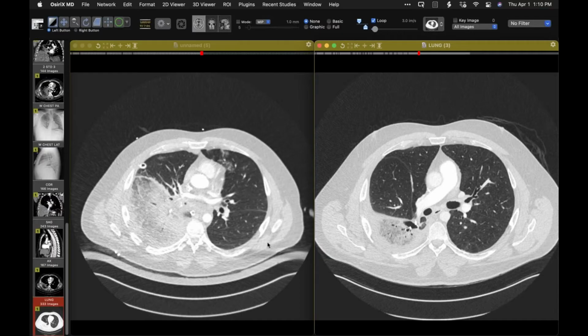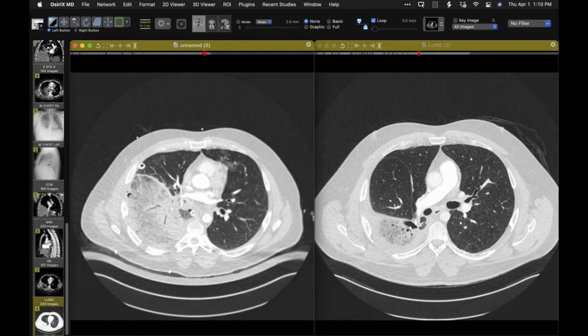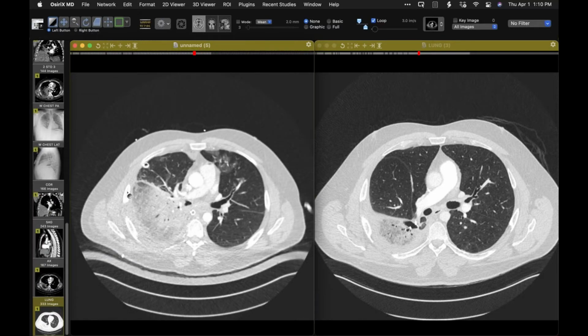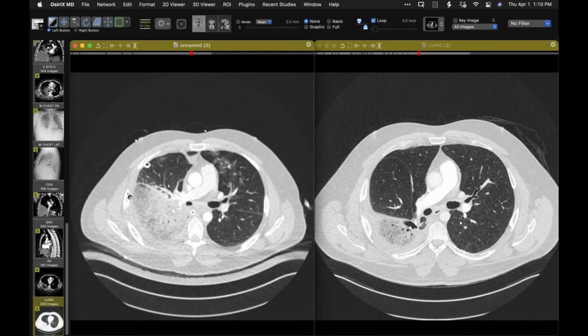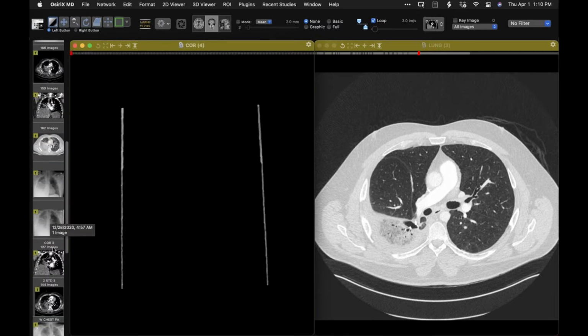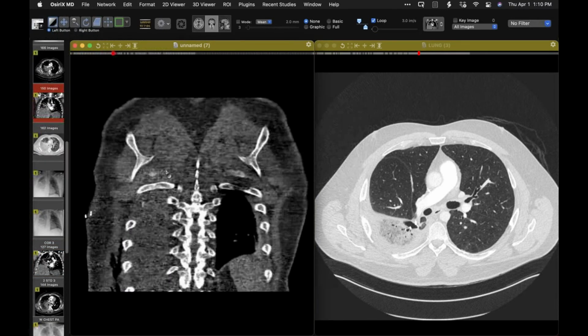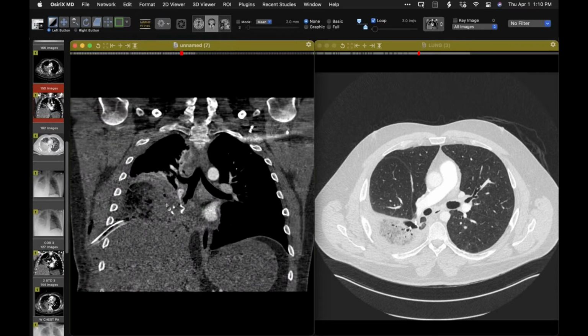Any comments otherwise? Do you think I have it correct? I agree. Yeah. That's venous. You said venous infarct, right? Well, I think, in relation to that pulmonary artery, let me go back to the coronal. I think it's likely, let me go back to say this. I wasn't looking at the imaging. I just kind of had that venous infarctable lobe appearance, but did they knock out the PA?